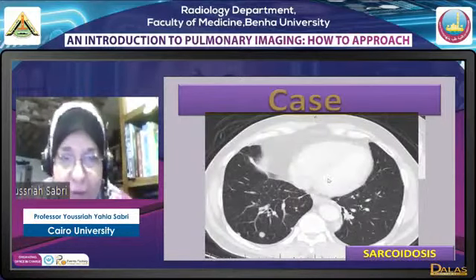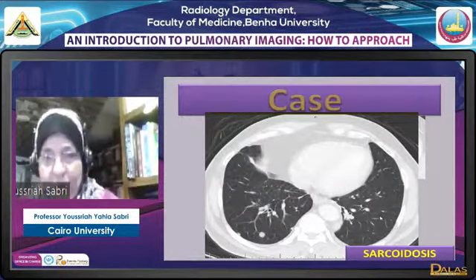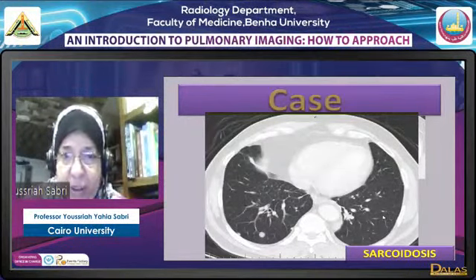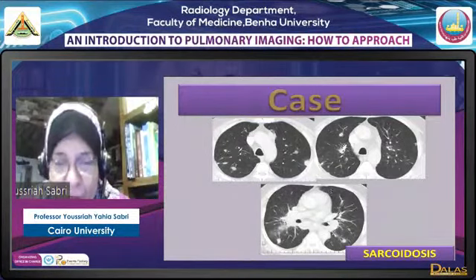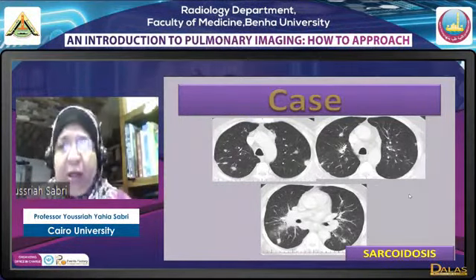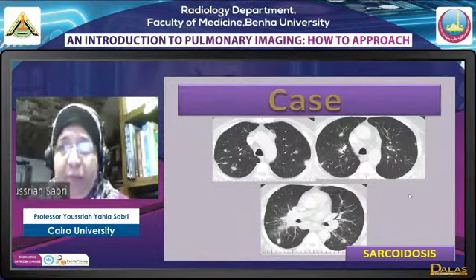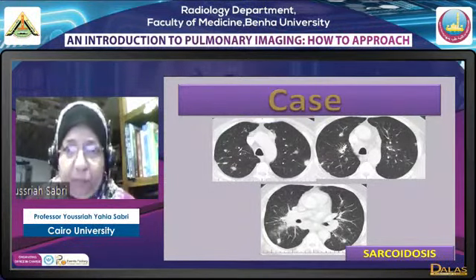Now here, if you see posterior on the right side, just posterior to the heart and the diaphragm, there are few prominent interlobular septi. There are also nodules. Okay, this is a case of sarcoid, and in sarcoid you see multiple lesions. Actually, you don't see single lesions. There are nodules, there are perihilar opacity, there are hilar prominence, there are prominent interlobular septi. Again, a multimorphic disease. The two classic multimorphic diseases, meaning a disease presenting with more than one appearance of lesion, are classical tuberculosis and sarcoidosis.